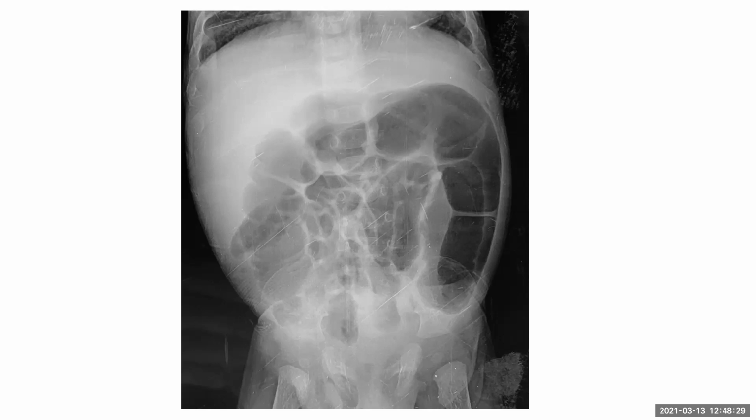Now I'm looking again for any cause. This is a neonate, and I'm again looking for any obvious abnormality. I can now appreciate some air lucencies present in the right inguinal region. I'm a bit worried about an inguinal hernia, as some lucencies can be seen in the right inguinal region. I would be worried about an inguinal hernia which is strangulated and causing upstream bowel obstruction.